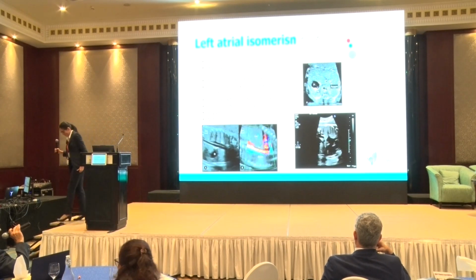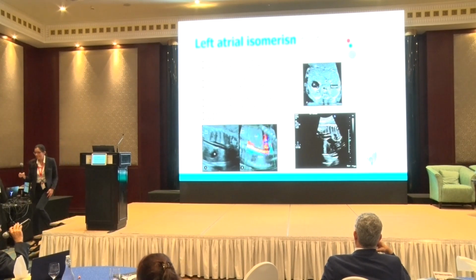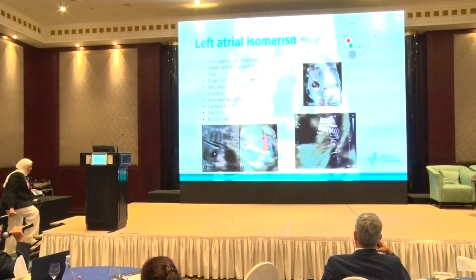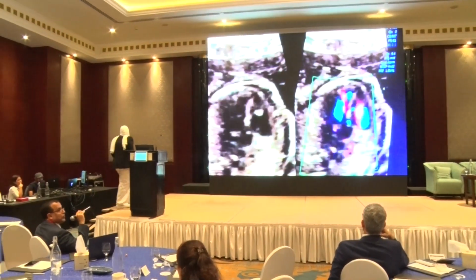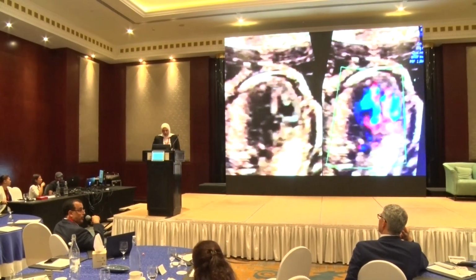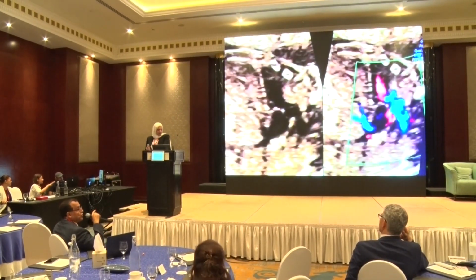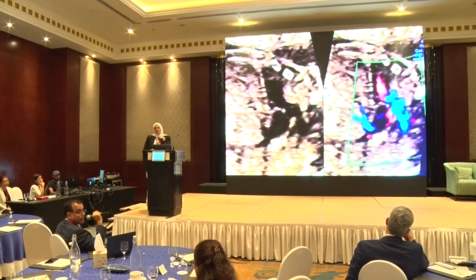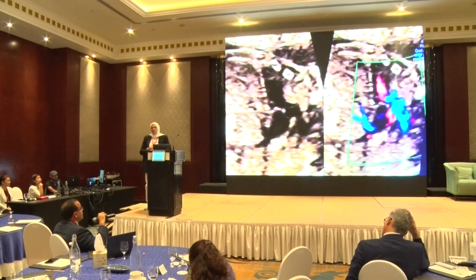Just to comment on the azygos, you very frequently will see the azygos. The problem is that you're going to see it very small. Why? Because most of the blood will go elsewhere. When we scan the patient after birth, we see the azygos, which usually joins the SVC near the entrance of the right atrium. That's when we want to follow it. It's not difficult for us to identify it, especially in patients with ASD, where we get confused: what is this thing coming right there? That's usually the azygos. But usually it's small and not an important thing.